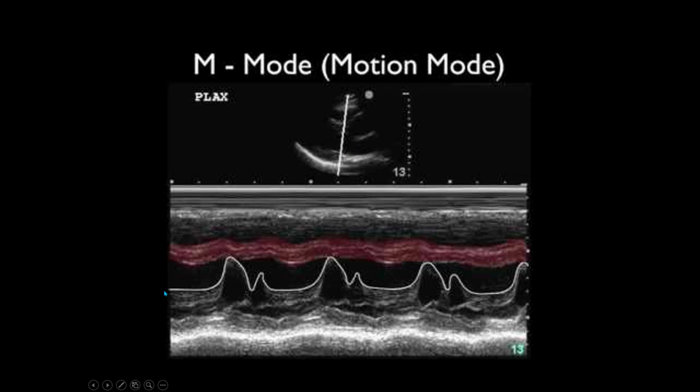So this is basically the movement of the mitral valve, okay? So that is motion mode. This is also not included in your syllabus. So whenever we are giving you the ultrasound picture, you can easily write down grayscale B mode ultrasound, okay?